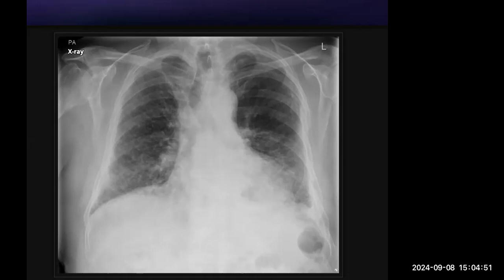So in this patient, these findings make me think of some fibrosing interstitial lung disease leading to volume loss in the lower lungs. That is my first possibility. I cannot see any pleural plaques, any calcified pleural plaques to suggest asbestosis. So my possibilities would be an interstitial lung disease, a fibrosing interstitial lung disease like usual interstitial pneumonitis or a non-specific interstitial pneumonitis.